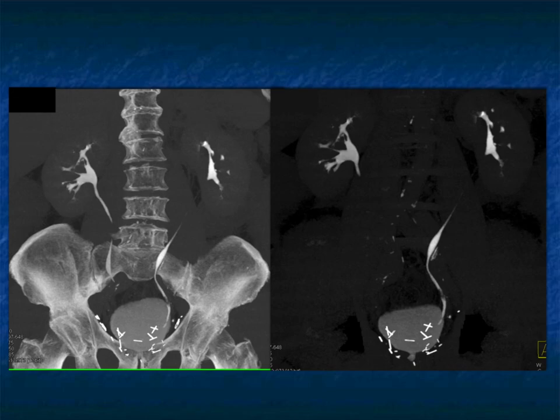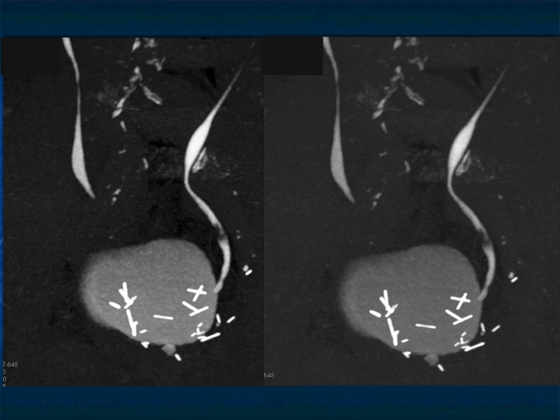We also like to recommend MIP imaging. MIP is really good for looking at the calyces and ureter and showing you that tumor from the case we just looked at. Again, there's no hydronephrosis, but look how obvious the tumor is on the MIP images right there and there.